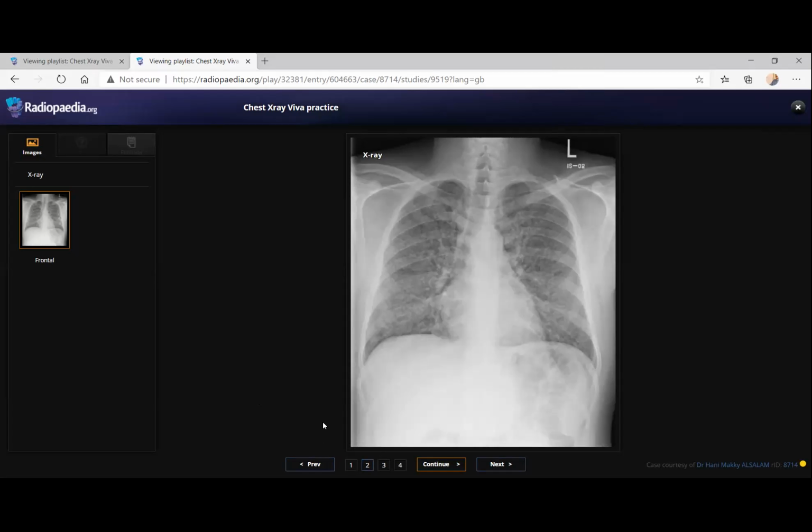Yeah. Okay. So there are nodular shadows which are involving both lung fields diffusely, and both costophrenic angles are free. The cardiomediastinal contour is within average. The bony cage is normal. I'm not able to detect any pneumothorax or pneumomediastinum. And so this looks like a diffuse interstitial lung pattern. I would like to move on to a CT scan of the chest to be able to delineate the distribution.